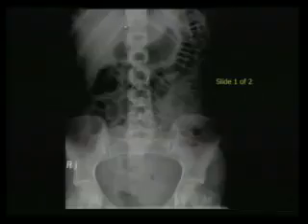You always got to look for calcifications, and sometimes it's really subtle. There's some calcifications in here, and if you really magged it up, what does this look like? Anybody know what this calcification thing looks like? What does this look like? A skull, there's spine, there's a little arm. It's a fetus.